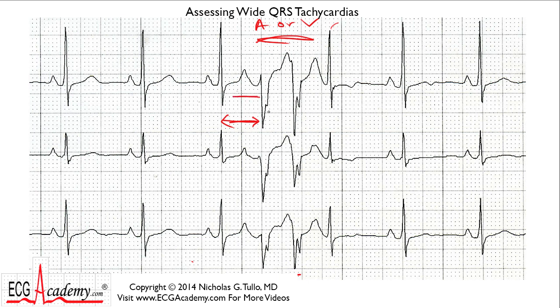But generally, when you have a premature beat, you've got a T wave. And so therefore, you have to look for a P wave superimposed on a T. And the way you do that is to compare the T waves of the last couple of beats. Look at how nice and smooth those are. And now look at that T wave, it is distinctly different. Look at that tall peak on this. And you can see again here, this is a nice smooth T wave, whereas this one has a sharp spike on it. It's like Mount Everest over here.